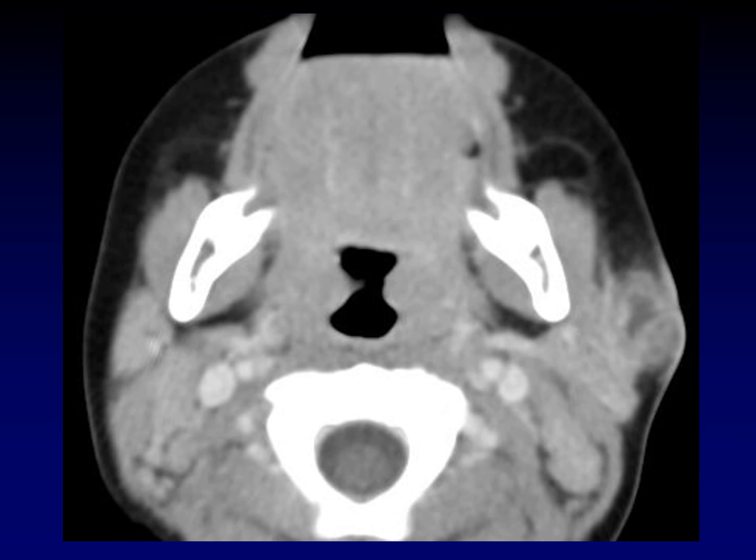The type 2 first branchial cleft cyst occurs more inferiorly. It occurs at the level of the angle of the mandible. So this is in the subcutaneous tissues at the level of the mandible, and that's where you will find a type 2 first branchial cleft cyst, and you can see infiltration all the way around this mass because it happens to be acutely infected at the time of imaging.